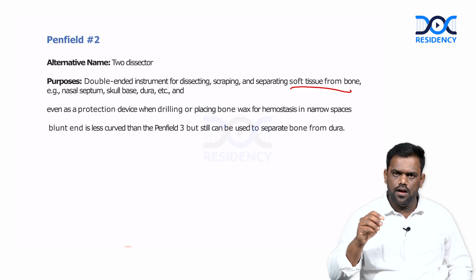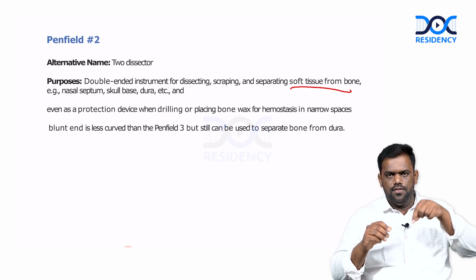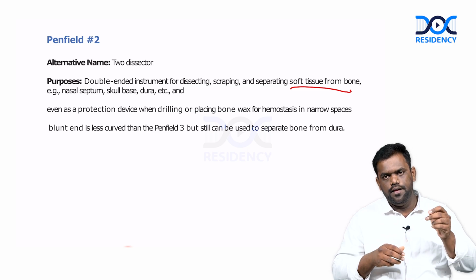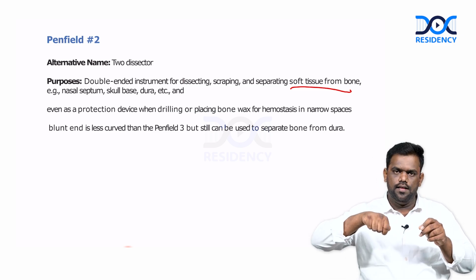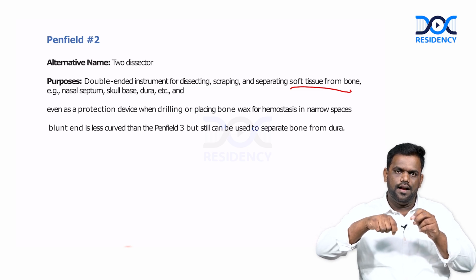Okay, so its main action is that it can also be used as a protection device. When we are going for a drill, if you want to protect the vital structures, we can use this Penfield, and we can drill on one side, so that the sharp edges of the drill will not come into contact with the vital structures.